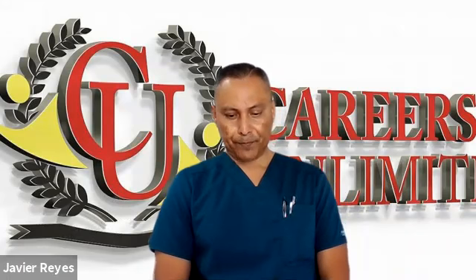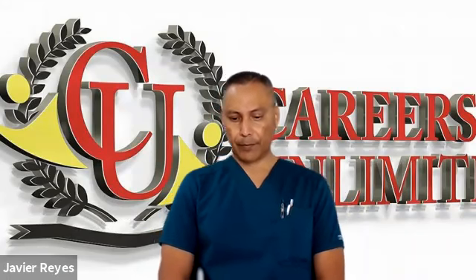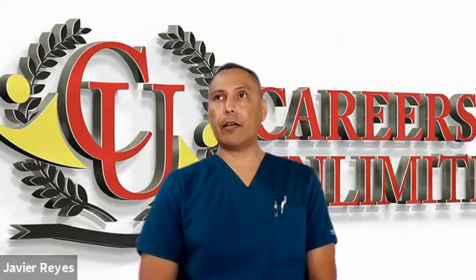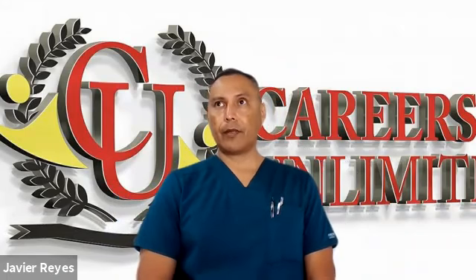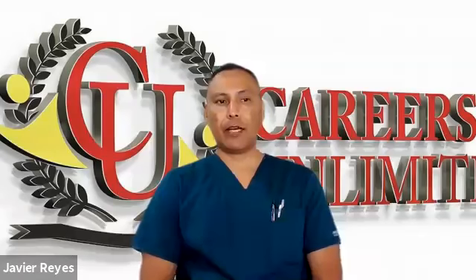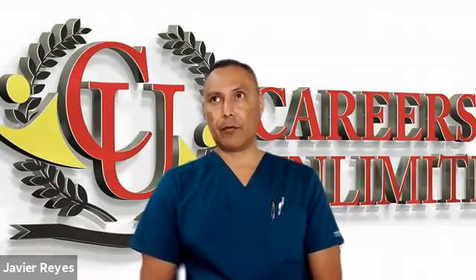So what is the interpretation? We'll call this a sinus Brady with what kind of block? A right or left? What kind of block would you call it? I would say this is a right bundle branch block.